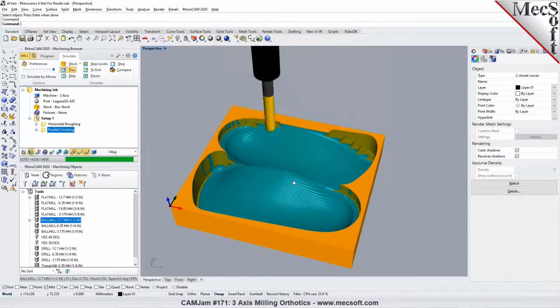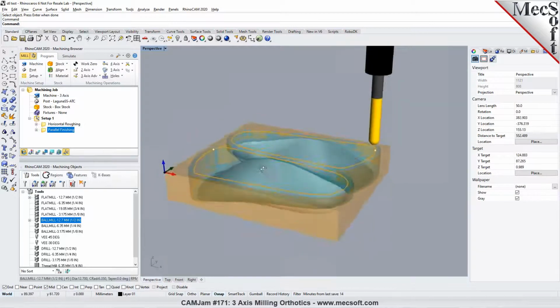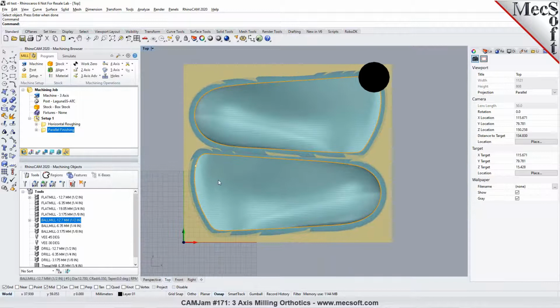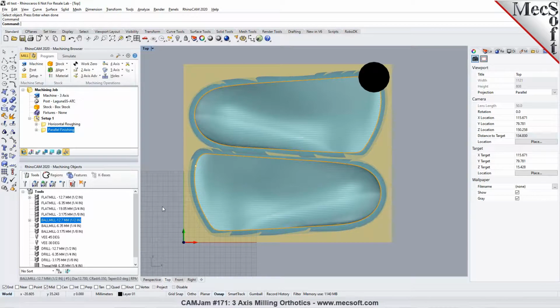So this feature is included with our standard configuration. Now we have additional types of 3-axis methods. We have advanced 3D toolpath methods like a 3-axis offset pocketing. The advanced 3-axis methods are available in the Pro and Premium configurations of the product, and I can show you how this works as well. Any questions so far?